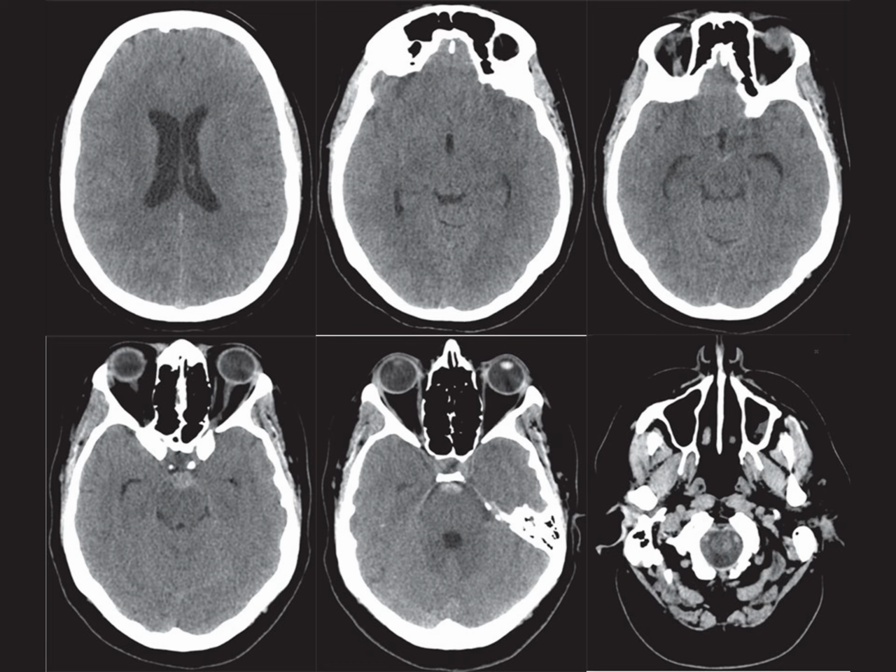Intracerebral hematomas can result from hypertension or trauma, while intraventricular hemorrhage might occur secondary to another hemorrhage within the brain. Recognizing subtle signs, such as hyperdensity in the basal cisterns or an increased blood load on one side, can suggest an ipsilateral aneurysm, especially if there's no trauma history. It's also important to consider signs of raised intracranial pressure, like midline shift, herniation, or hydrocephalus.